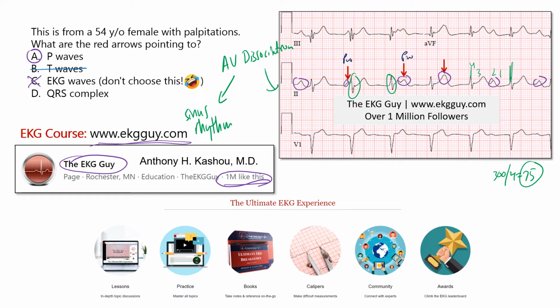And so if you have a ventricular rate like that, the QRS complex is also narrow in this case, okay. It may look a little wide in V1, but it's actually narrow. And so what we would call a narrow regular ventricular rhythm at a rate of 75 beats per minute is an accelerated junctional rhythm. Okay, so we will put that here.